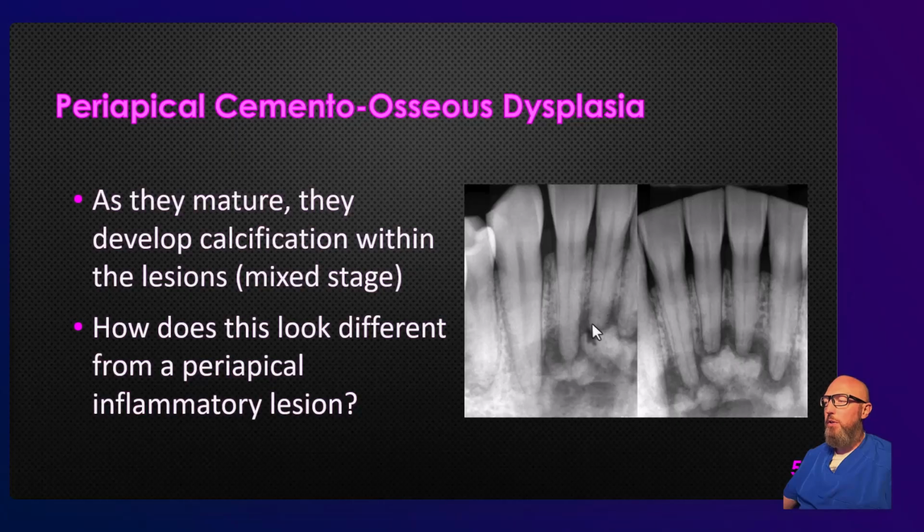For those, you do expect to see the radiolucency around the apices, and then that's surrounded by a sclerotic region of bone, or radiopacity. What you don't expect to see is this continued radiolucency around it. Then another thing I might point out, when you see the opacity, the opaque portion of Cemento-osseous dysplasia adjacent to the root of a tooth, you have that nice, intact, uniform PDL space. And so this is just our typical periapical Cemento-osseous dysplasia, but now in kind of the mixed, more mature stage.